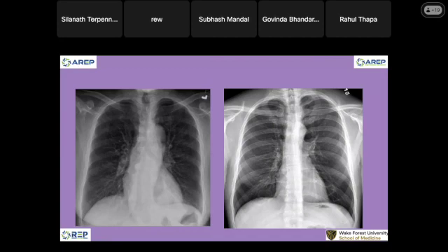Just a quick look, compare these two. What do we see on the chest radiographs? Cardiomegaly. Is this a normal chest? When you say cardiomegaly, we measure from the biggest diameter of the heart here to here, compared to the internal diameter of the chest from here to here. To me, does it just look normal to you by eyeball? The heart is probably about 1/3 of the chest. So he's okay. The patient came in just for an annual checkup. Can he go home? This one is not big.